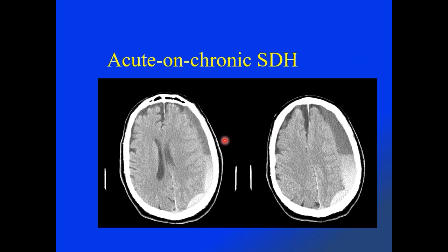This is an example of an acute and chronic subdural hematoma, where the patient most likely had bilateral chronic subdural hemorrhagic fluid collections with acute recurrent hemorrhage on the left side, causing hyperdense collections along the dependent portion of the fluid collection with mass effect on the left cerebral hemisphere and a mild subfalcine herniation.